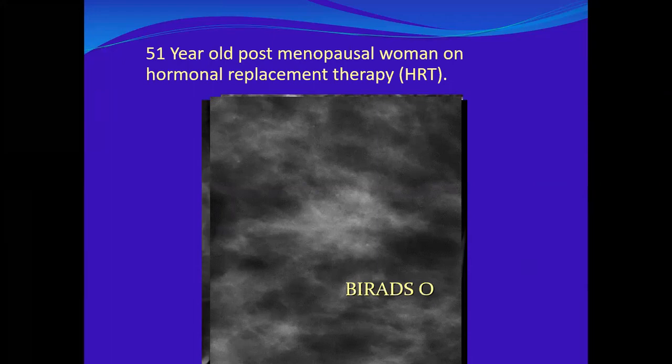Okay, complex sclerosis. Another benign differential also includes radial scar. Yes, radial scar is one of the complex sclerosing. Complex sclerosing lesion can be sclerosing adenosis or radial scar. You are right, 100%. Excellent. Yeah, both are differential diagnosis. Excellent. What else?